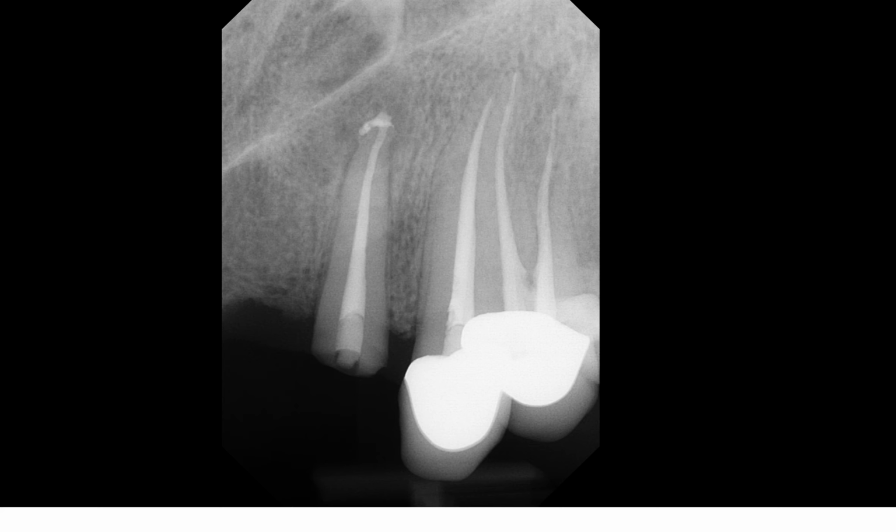So what you're seeing here is a periapical radiograph of the maxillary patient's left lateral incisor. And you can clearly see tooth number 10 is missing its crown with endodontic filling material extending to the apex and with some perhaps sealer extending beyond the apex with periapical radiolucencies as indicated by my mouse cursor. But that's not the point that I want to make here. There's a really unique finding on this periapical radiograph that if you pay really close attention to, you can pick it up. But it's a tough one.